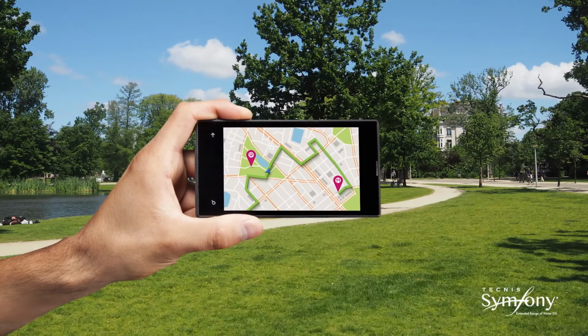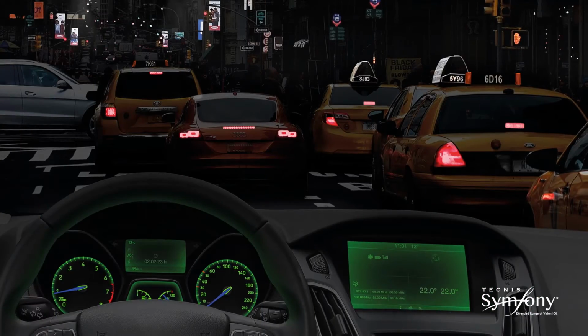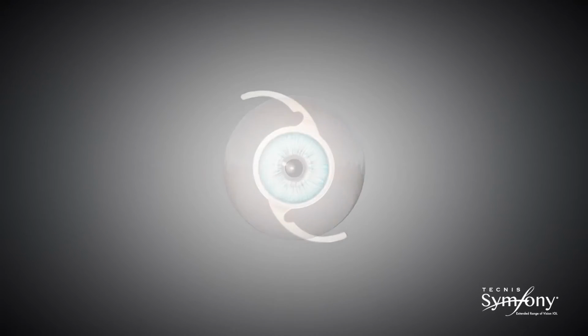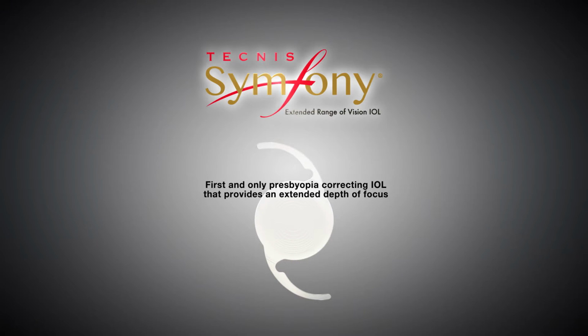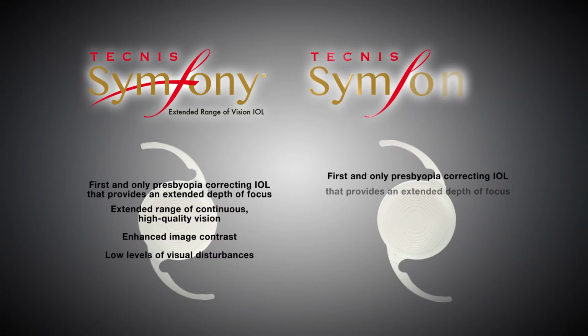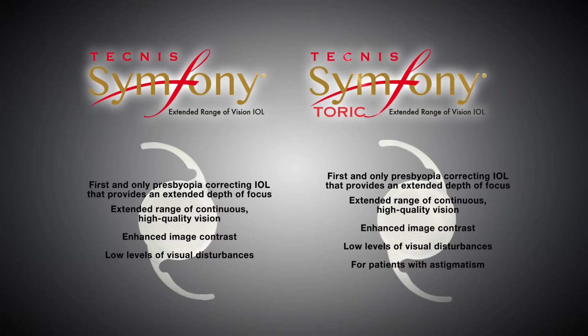Correction of chromatic aberration results in a sharper focus of light and increased image contrast, which is especially important in low light conditions. The Tecnis Symfony IOL is the first and only presbyopia-correcting IOL that provides an extended depth of focus, which results in an extended range of continuous high-quality vision with enhanced image contrast, as well as low levels of visual disturbances. In addition, the Tecnis Symfony Toric Extended Range of Vision lens provides all the benefits of Tecnis Symfony IOL technology for patients with astigmatism.